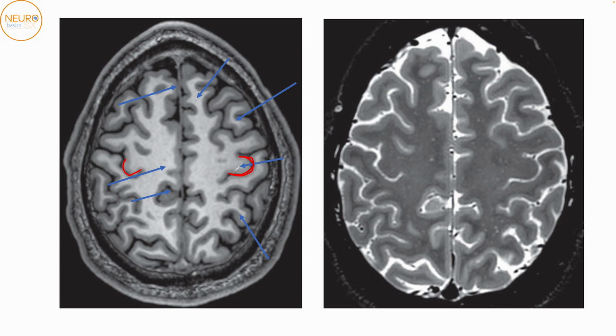So this helps you identify that this again is the precentral gyrus over here. The omega sign usually comes at the level of the middle frontal gyrus. Also posteriorly, the omega sign usually comes at the level of the inferior parietal lobule. So when you have the hand motor sign, anteriorly you will find the middle frontal gyrus, and posteriorly this is the inferior parietal lobule. This is the superior parietal lobule, and this is the inferior parietal lobule.